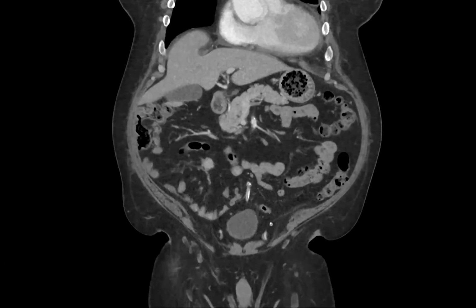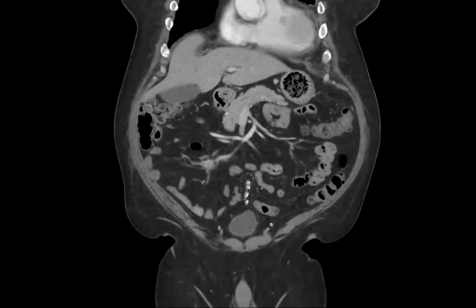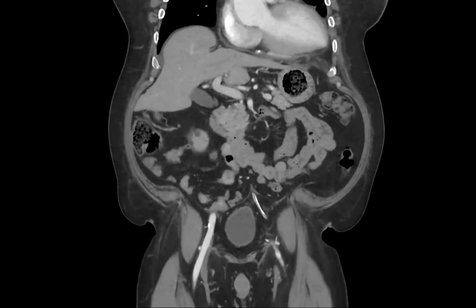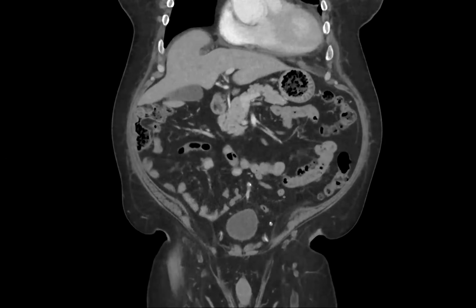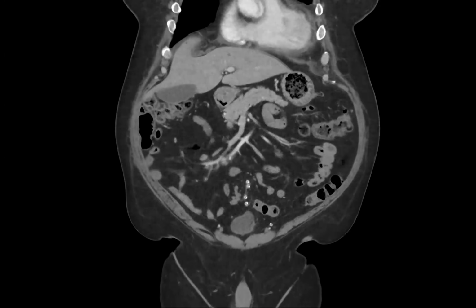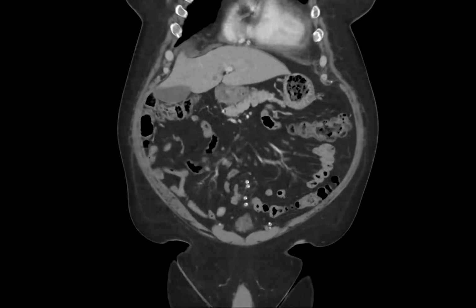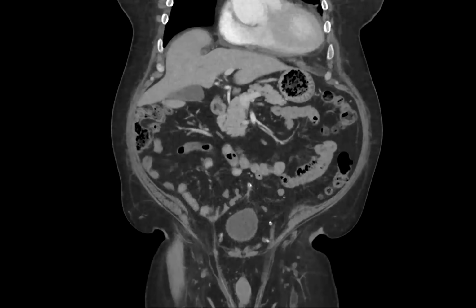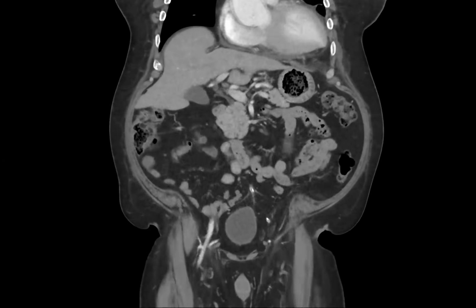This was a pre-TAVR CT. And so it's kind of preoperative planning, but there are incidental findings that are significant. Something in the mesentery, Nelly. Yes, yes, right there. Is that what you're referring to? Mhm. Good. Okay, there's more.